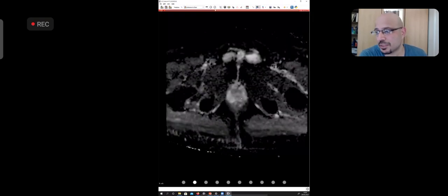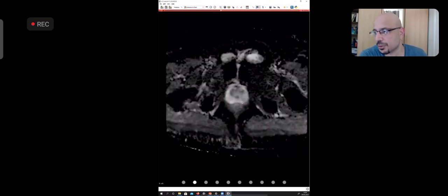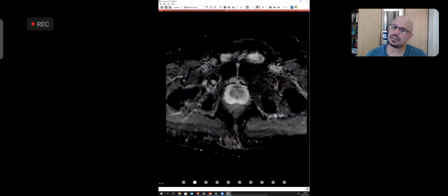Okay, so now you see it's a little bit of eyeballing, a little bit of subjectivity, and a lot of times experience tells you. You modify the way you decide which region is 2, which one is 3, and which one is 4, based on how many cases you've seen, how many surgical correlations you've done. Always ask the pathologist whether the biopsy showed cancer or not, and that guides you and you evolve over time in how seriously you take lesions.